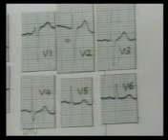Lastly, we study the T wave morphology and note the leads where it is tall, flat, or inverted. The details of STT changes are studied in the next section of this cassette.